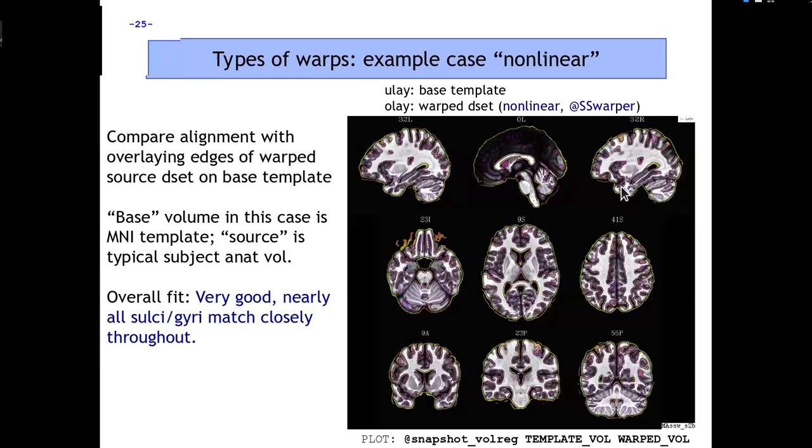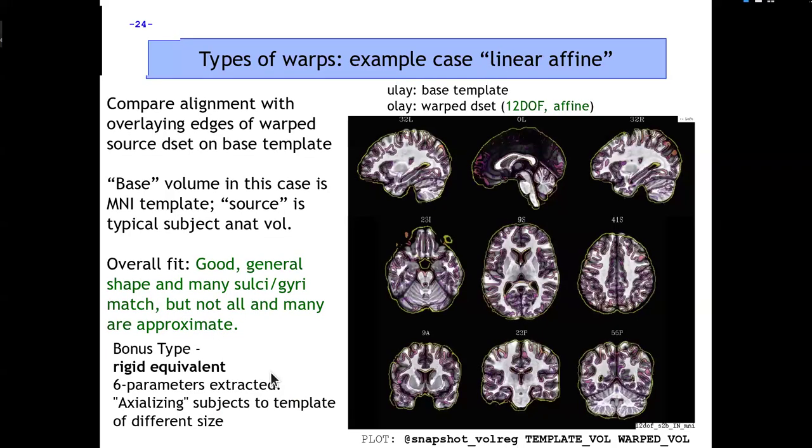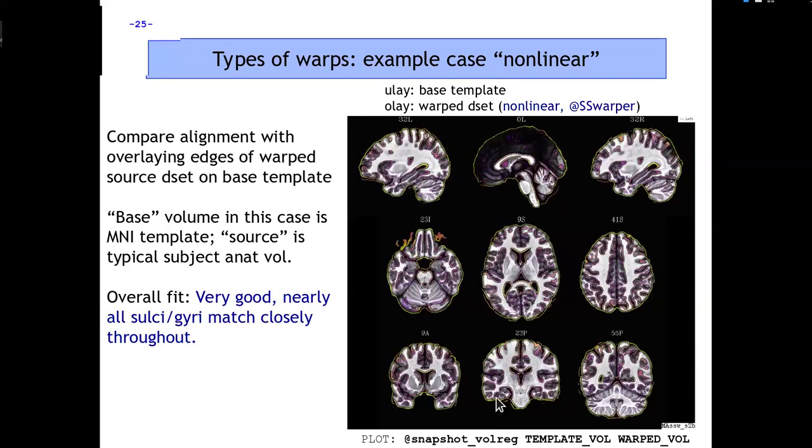The human brain is just going to look more similar here across subjects than up here across subjects. Now if I go back and forth through these different degrees, this is rigid, affine, nonlinear. And you see really the benefit of nonlinear locking in many, not necessarily every sulcus and gyrus, but quite a lot of them. All right. So anyways, this is what we're trying to do with the alignment, and why when we're aligning different subjects to each other, we're almost always going to use nonlinear alignment.